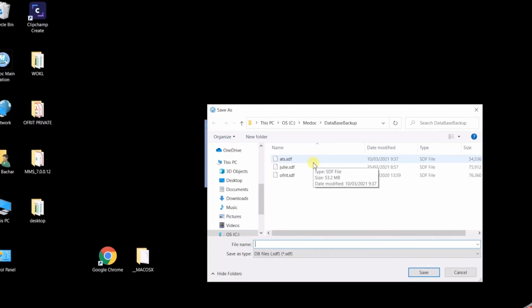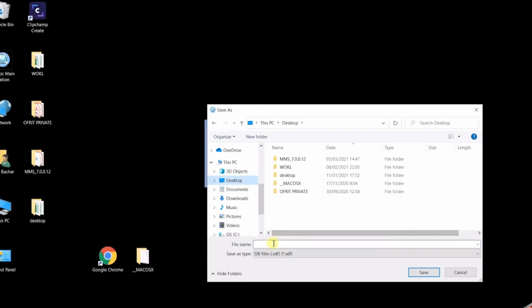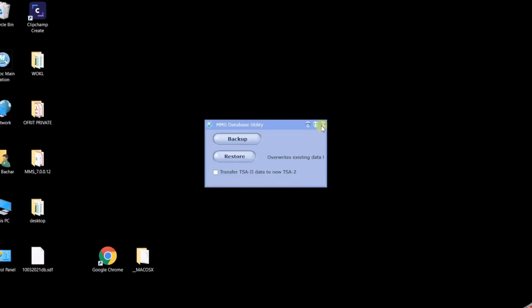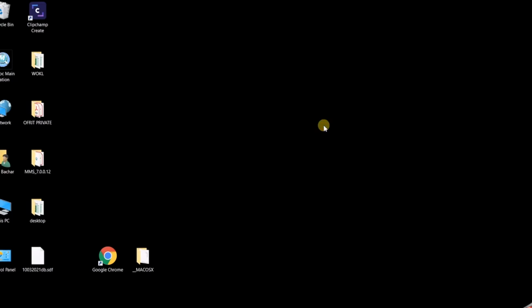So I would like to encourage you to back it up somewhere else, for instance on your desktop. This is a favorite place for me. And I'll give it the date of today. And let's just save it. And let's close it. Now let's install the new MMS.